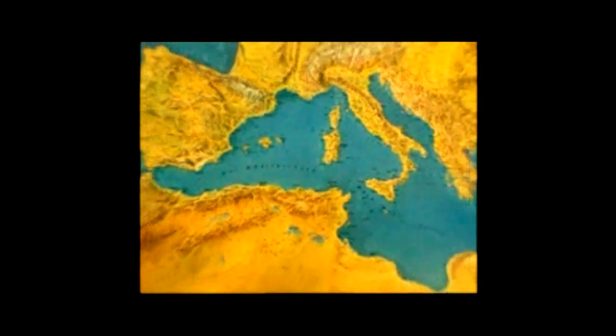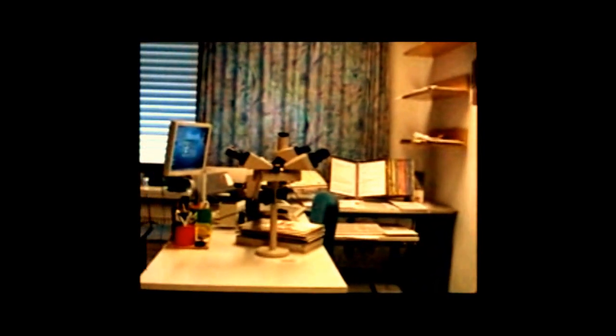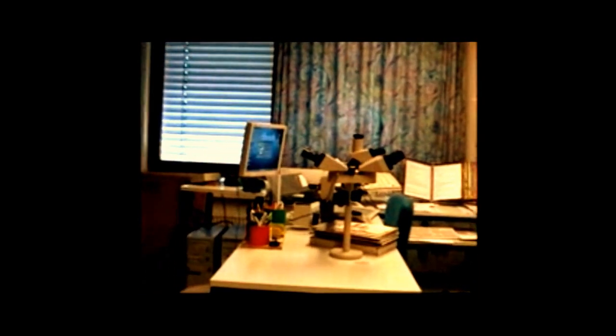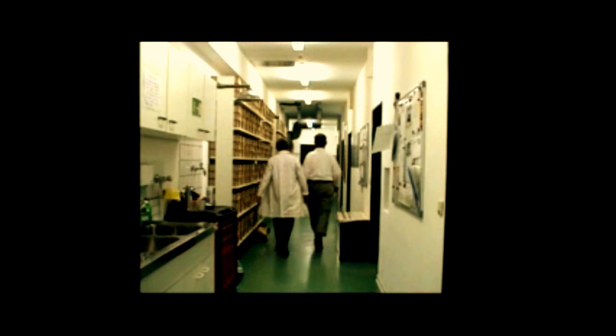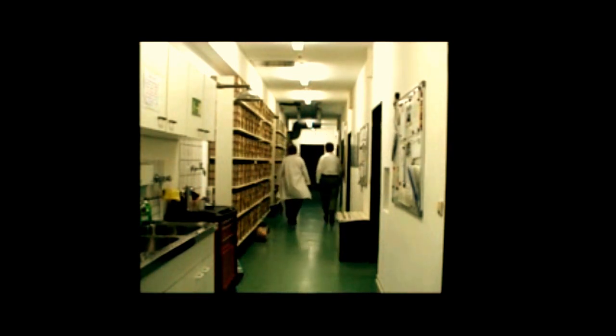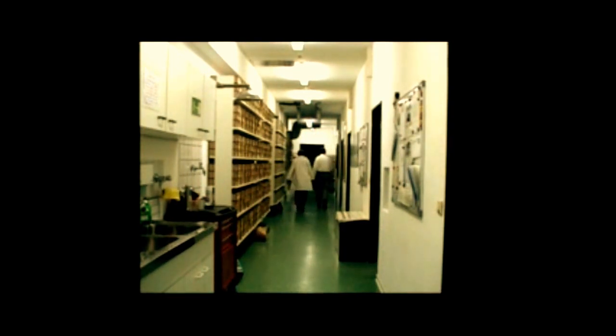We wanted colleagues in all parts of the world, such as a pathologist living in Bora Bora, to be able to file data and pictures of whatever new exotic dermatitis that had never been observed before, or a Russian dermatopathologist from St. Petersburg to create a new pattern such as panniculitis with dense lichenoid inflammation, and to file his personal histopathological criteria for further use.